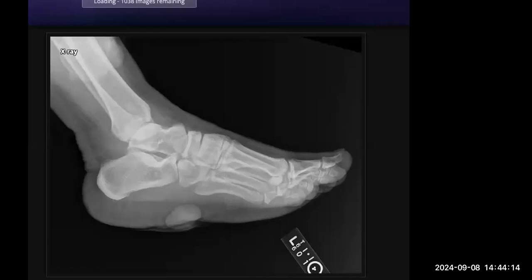It could be a foreign body granuloma, which could have penetrated and formed a mass. Another possibility: it is not hypodense, which rules out lipoma. You mean radiolucent? Yeah, radiolucent, which rules out lipoma. Anything else? Other than that, there is a slight radiolucency around the lesion.